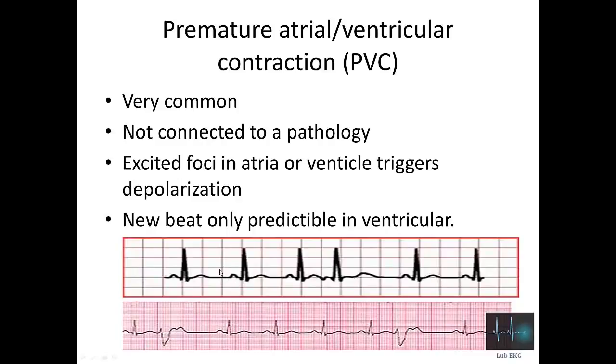Well, as we talked about, if the ectopic beat is originating from the atria, you will have thin QRS complexes everywhere. If they originate from the ventricle, you will suddenly have a thick one. Same as this one. These are two ectopic beats originating from the ventricle. And here you have an ectopic beat. This is the ectopic beat.